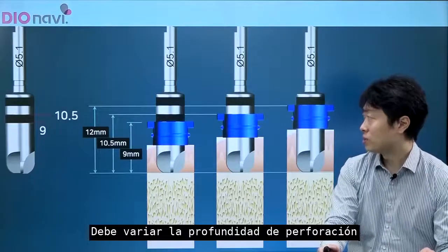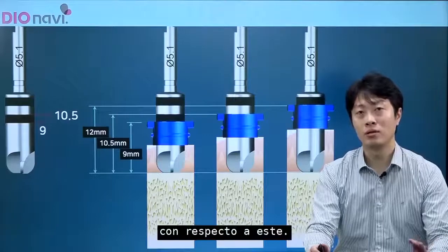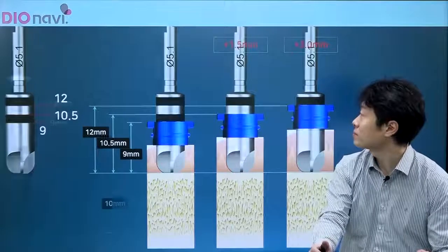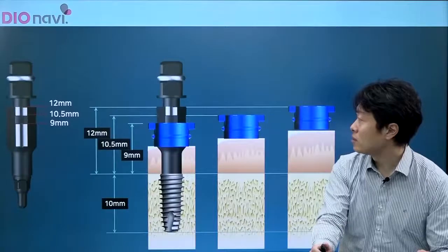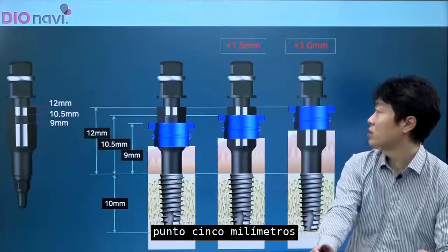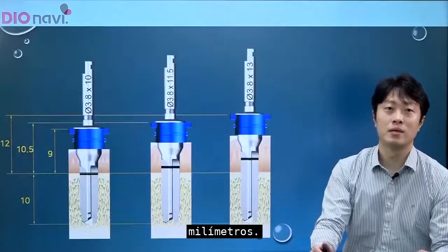You need to vary the drilling depth depending on the offset. Regarding this, I will discuss further later when we cover the drilling protocol. The same goes for the implant connector. The lowest line is the 9 millimeter. The line above it is marked as 10.5 millimeters and the line above it as 12 millimeter offset.